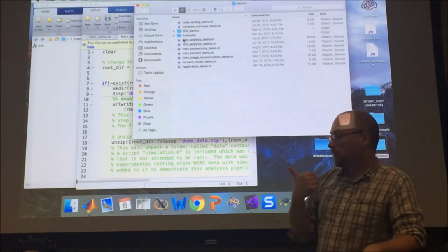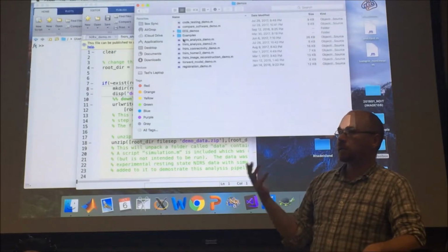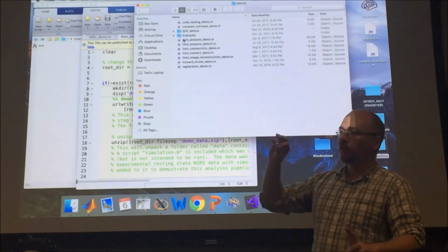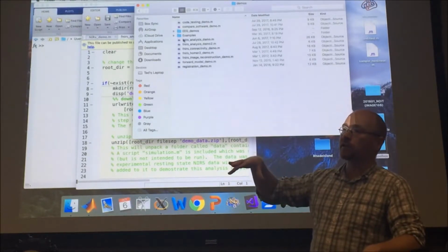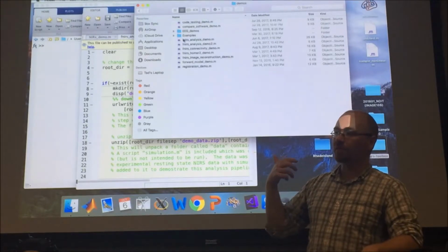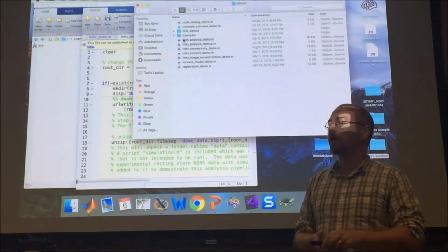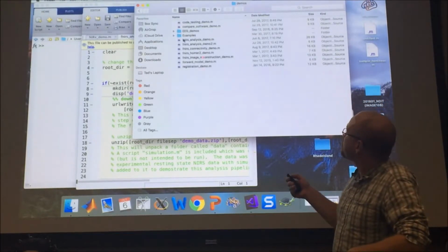What's nice about the NIRx data collection and format is that there was a checkbox to set up your montage to be hyperscanning, to do 2-person scans. And that information gets propagated into my toolbox. So for a lot of the hyperscanning modalities, you can just read in your NIRx data directly, and it runs the hyperscanning on it with those modules. You don't have to do anything special.